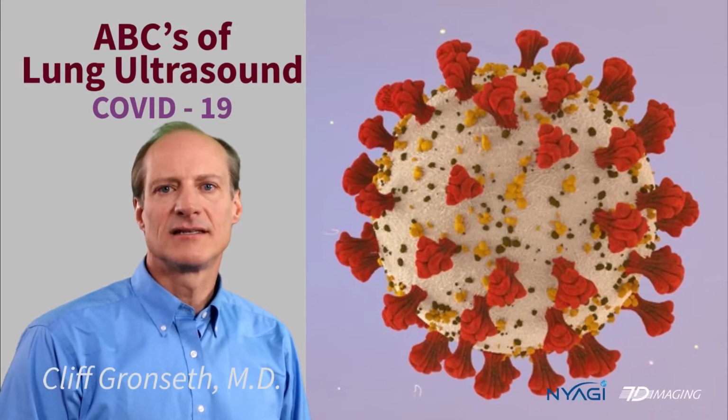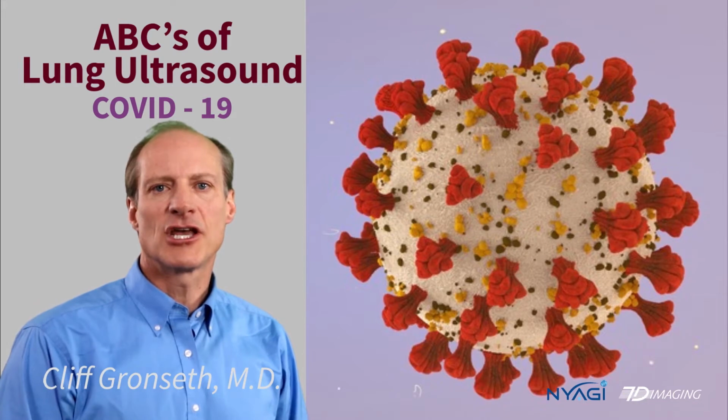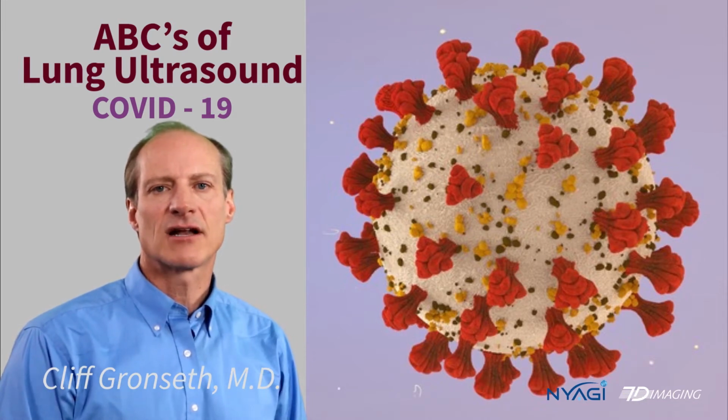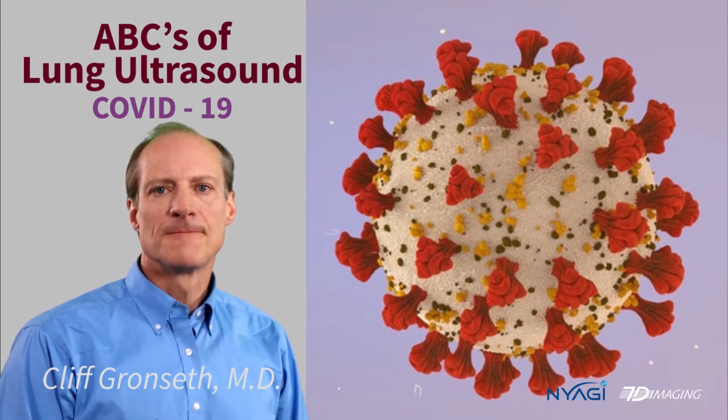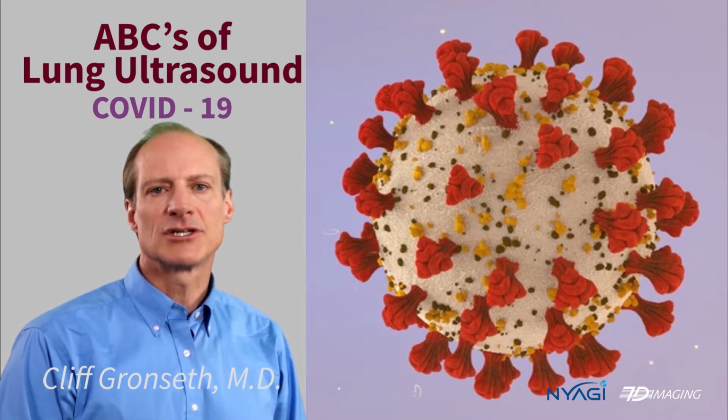Hi, this is Dr. Cliff Gronseth presenting an ultrasound video on the basics of lung ultrasound with regards to COVID-19 virus. As you know, COVID-19 is ravaging the world.